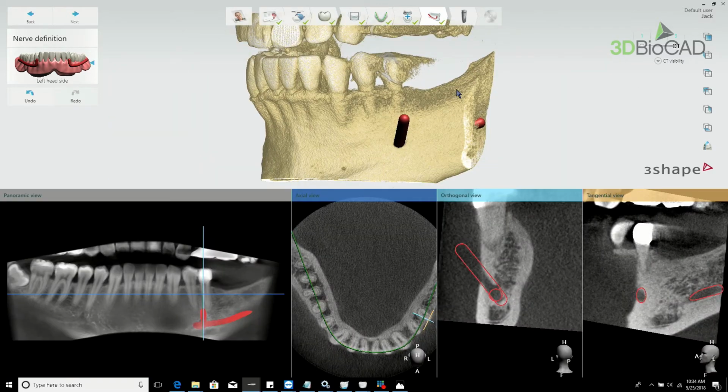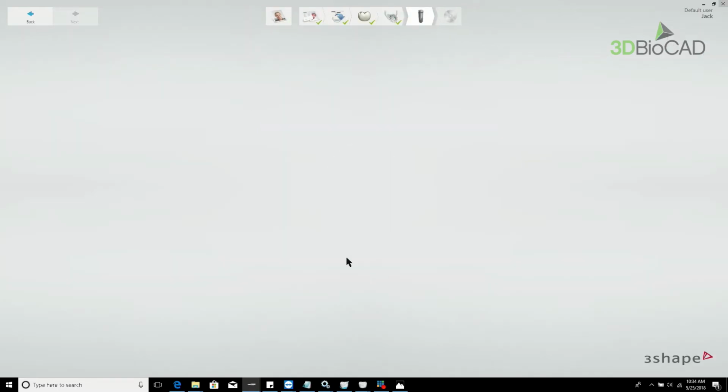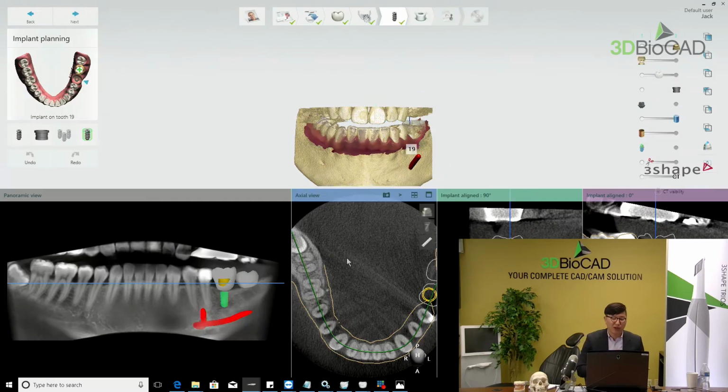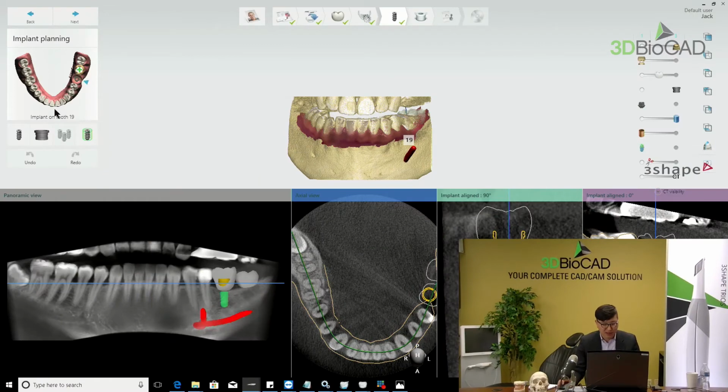If you have more images, we can go over more here. Okay. So planning. For the planning part, if you're a dental lab technician, you should finish it with your doctor. No matter what, discuss with your doctor, get approval, get confirmation, and finish your guide, okay? If not, it's gonna cause big problems. So to me, I can put the implant here virtually. Let me just exit out, delete that out.